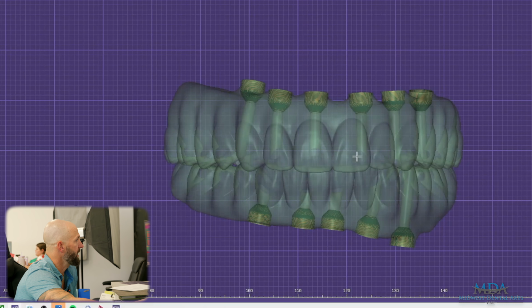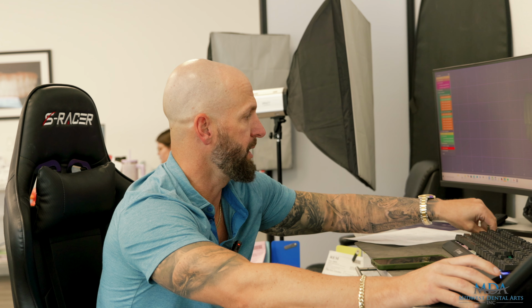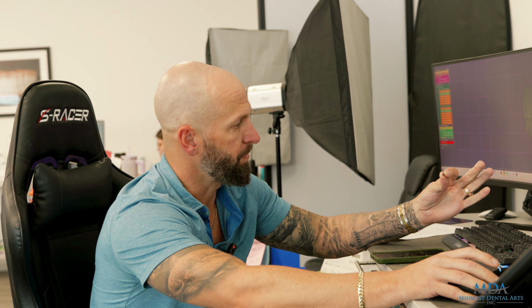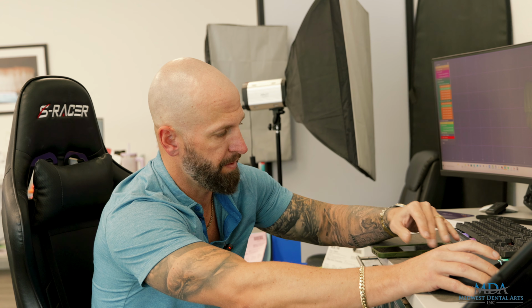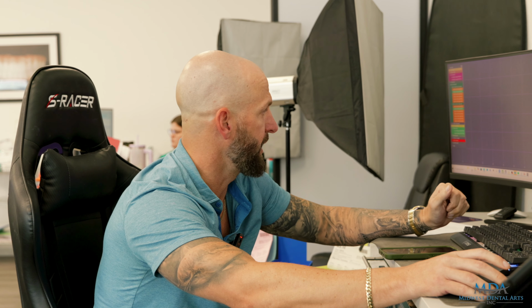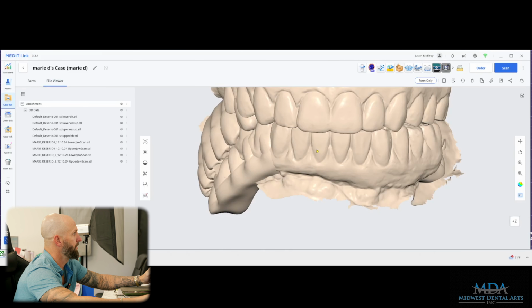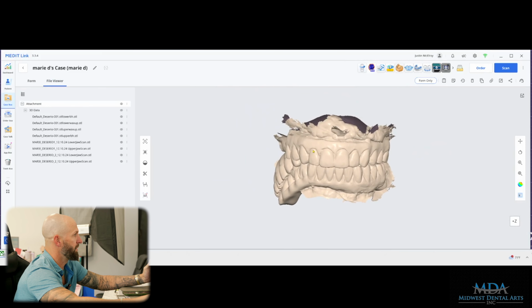Here's the implant scan bodies, and if you guys see here on the screen, I really like these BH caps. You know, the shapes, the low profile, if you need to use the indexing denture like I've talked about before. But this cap, when it's scanned in healed tissue, you're going to see the alignment points from surgical data, that geometry going back into the healed tissue scans. So let's take a look and see what we have here. So I've uploaded all the scans. Kind of looks like a mess.